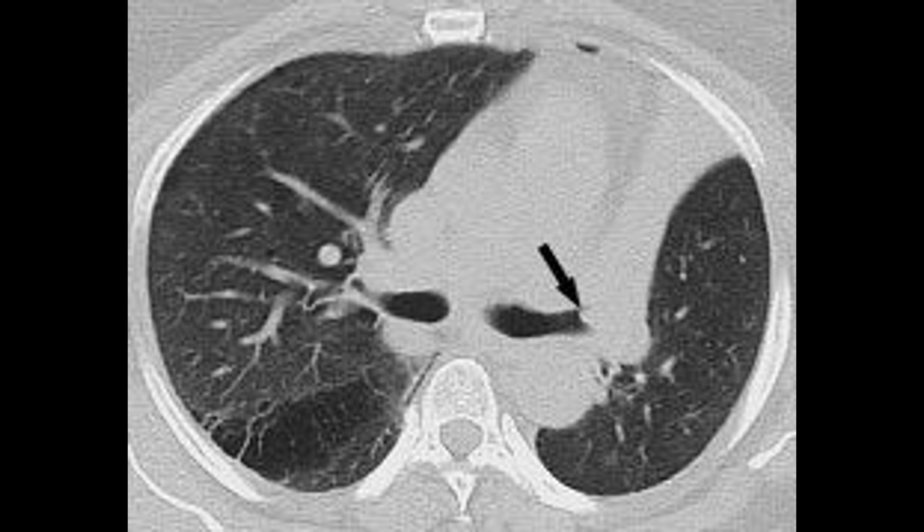On the lateral radiograph, the collapsed upper lobe produces an anteriorly located opacity bordered posteriorly by the oblique fissure and anteriorly by the hyperinflated right upper lobe. The lower lobe fills the space behind the collapsed segment, producing the characteristic appearance of increased retrosternal lucency and the apparent prominence of the oblique fissure.